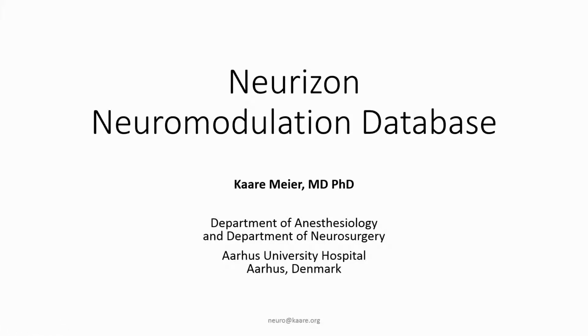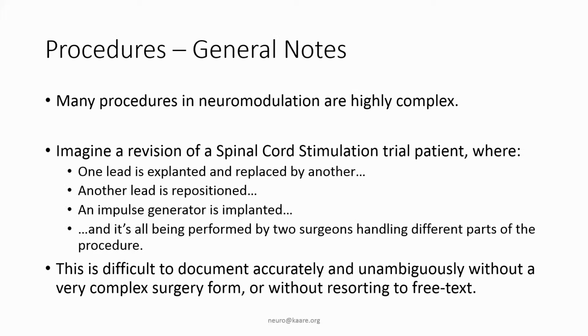This video will cover the essentials of procedure registration in the Neurizon Neuromodulation database. First, we should note that very many procedures performed in neuromodulation treatment are highly complex.